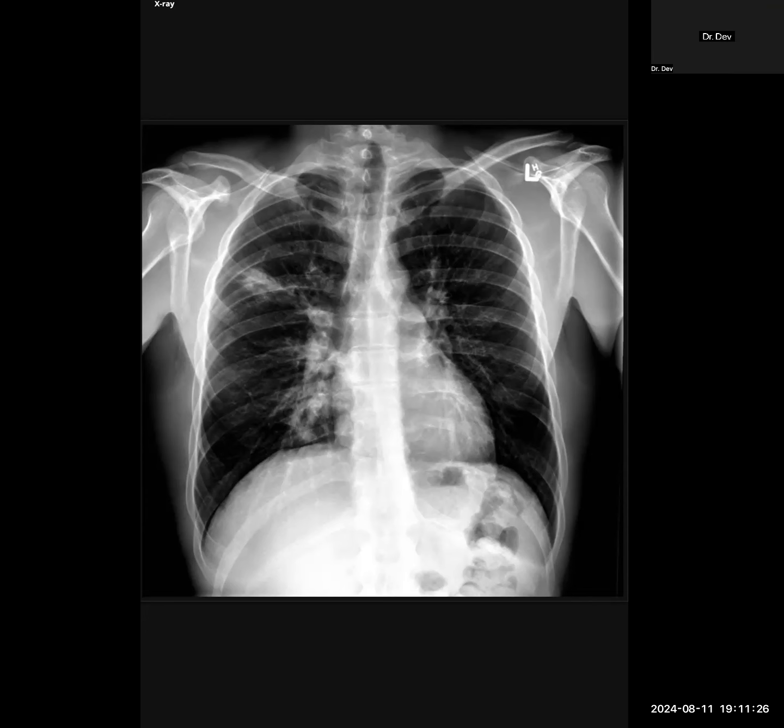If I were to tell you that the patient is a known case of cystic fibrosis, then what do you think? In that case, I would think of a dilated bronchus with mucous impaction as the first possibility. And there are other similar areas noted in the right lower zone as well.